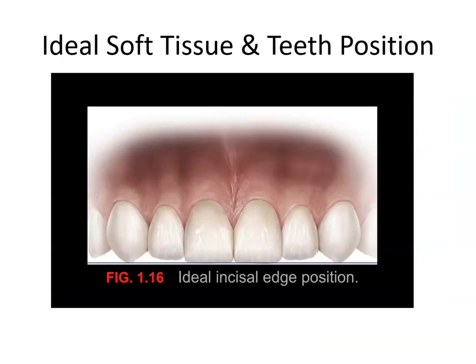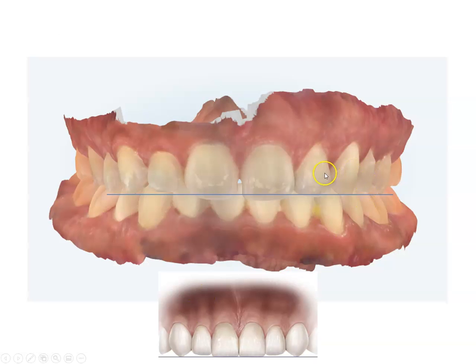And if we take a quick look at Sandra's line, we could see that her sharp teeth are almost there, but her 2 front teeth, they're really low. And if we remember how we looked at her lips, these teeth were touching the lower bottom of the lip. So that means we could push these teeth in a little bit. And this is the lateral. It's in the ideal position. It should be slightly away from the line where these other teeth are supposed to be on. And this one maybe needs to be pushed up a little bit, or later on we'll reduce it to create symmetry.